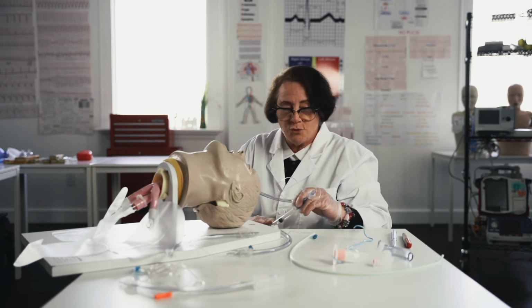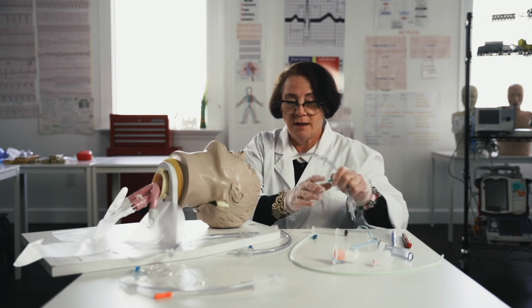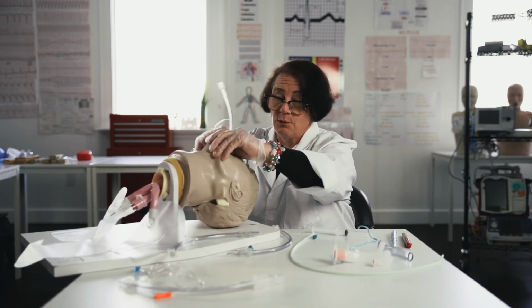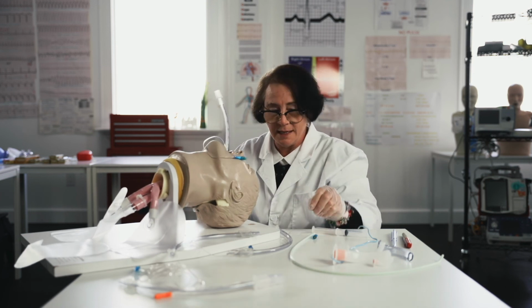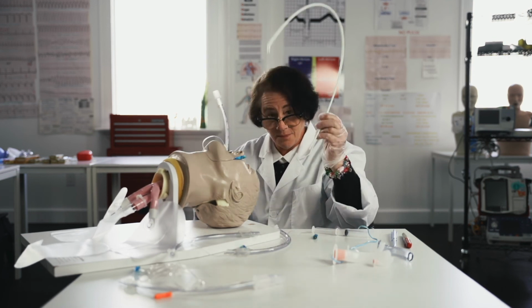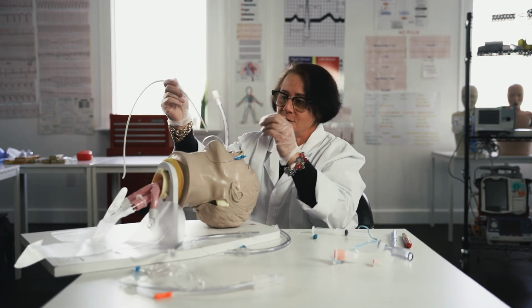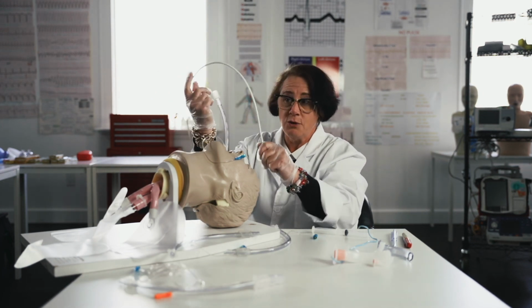When in doubt with endotracheal tubes or tracheostomies, don't just pull them out. The patient's airway might swell and you might not get a new one in. Call anesthesia. They have all the fun toys. They're going to bring a bougie. So a bougie, there's a ruler here. They know they're past the vocal cord.